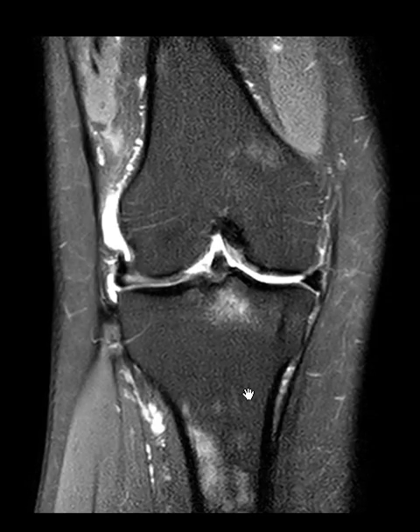So in a patient who's 61, normally they will not have any active red marrow. This is probably just patchy active red marrow. We call it red marrow reconversion. When we're young, we have active red marrow in the shafts, and over time that goes away and it's replaced by fatty marrow that's very uniform like this. It should be low in signal.